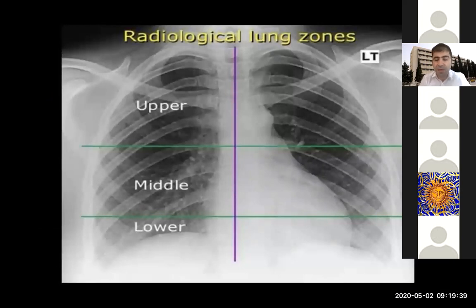And to make it easier, we divide the chest X-ray into zones.